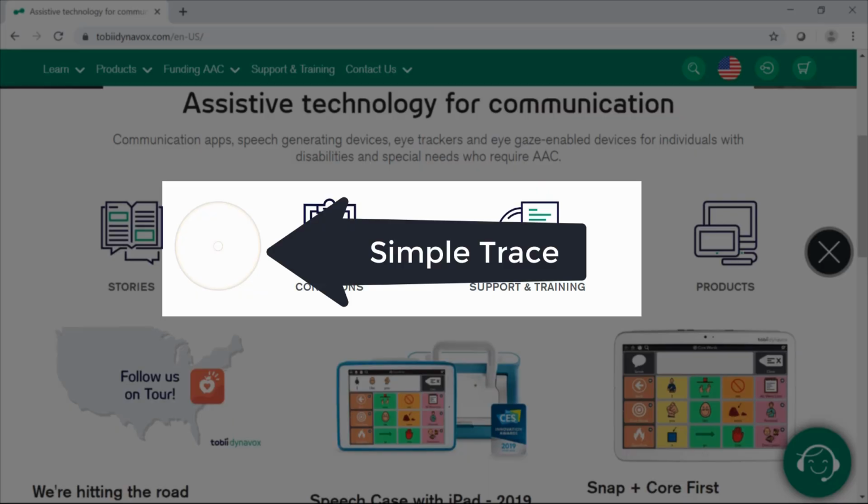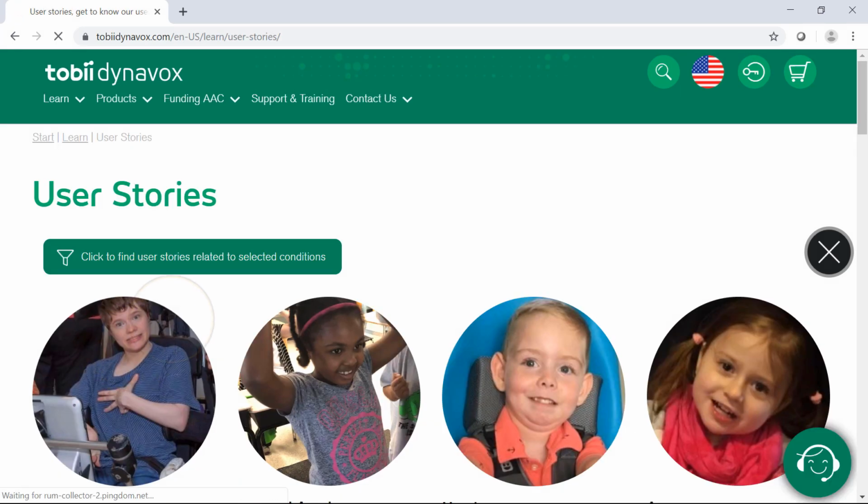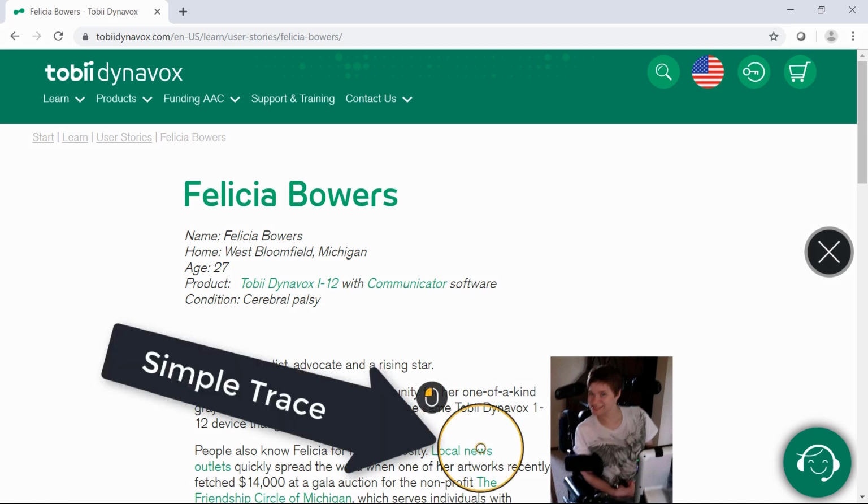A Simple Trace feature is also provided for fast, intentional selections. Simple Trace works with one of the pre-selected functions, left-click or adjust target. It follows your gaze, locks on the user's fixation to aid the user in hitting the target, and unlocks when the user exits the trace before the dwell animation completes. Simple Trace further reduces users' anxiety, confusion, and errors by providing exactly what a user needs at a particular moment of interacting with their computer.